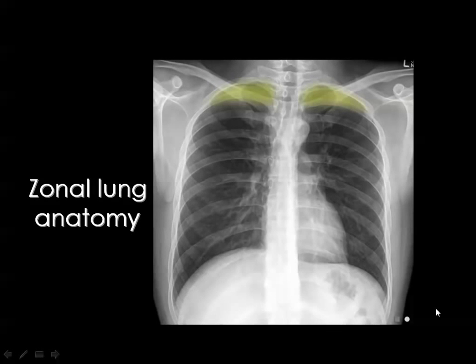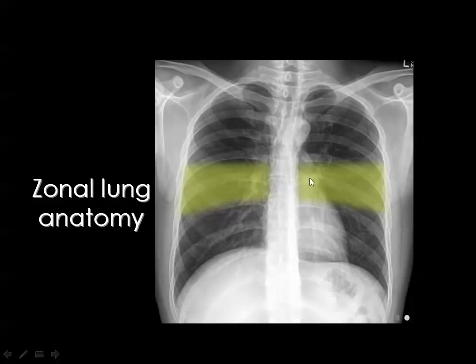And if you have a pathology in the lung and you want to locate the pathology in a specific area of the lung, and you know that any radiograph is just a patient facing the physician, and then this is the left side of the patient and this is the right side of the patient, then the highest area in the lung is known as the lung apex, and the zone at the level of the hilum is known as the middle lung zone.